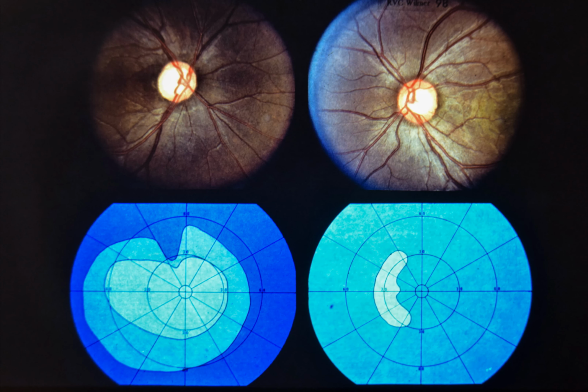Slide 98, Quiz 5. 2 years ago, this 18-year-old male had a normal eye examination. He now complains of progressive loss of vision in his right eye. The right eye has light perception vision and an afferent pupillary defect. The left eye has visual acuity of 20/20 with normal color vision. The optic discs are shown above and the visual fields below.